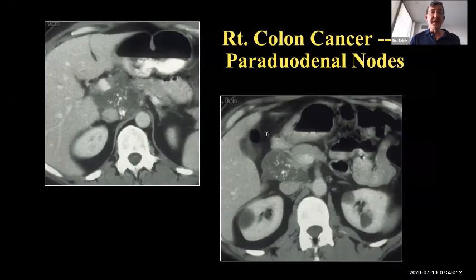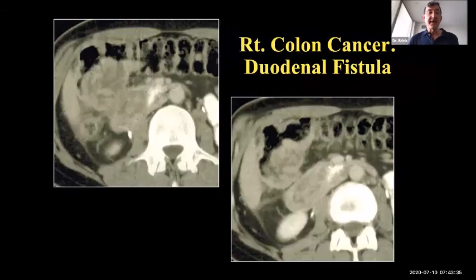And there's another patient with a right colon cancer that's been resected now, with larger low attenuation nodes, also having reached this location via the duodenocolic ligament with stippled calcification, again highlighting that continuity with lymphatics of the right colon, potentially resulting in gastric outlet obstruction. And this final case shows us a mass in the hepatic flexure. This is a cancer of the colon, extending directly through the right edge of the transverse mesocolon, the duodenocolic ligament, to invade the second duodenum. And we see that very nicely on these images.